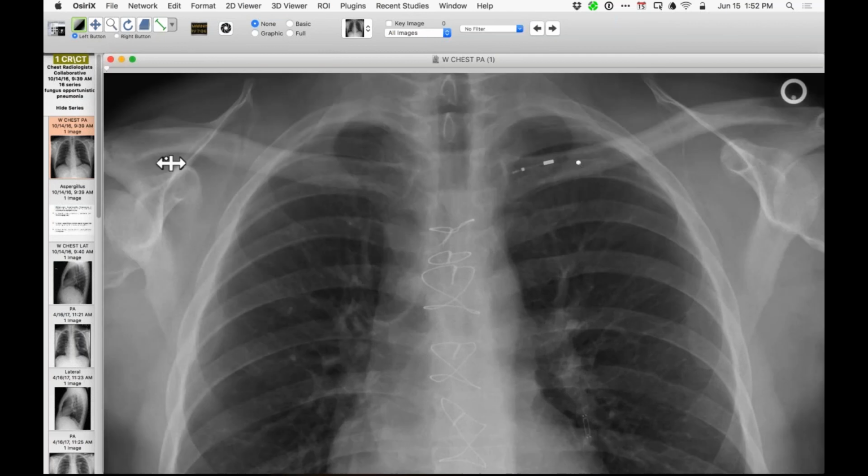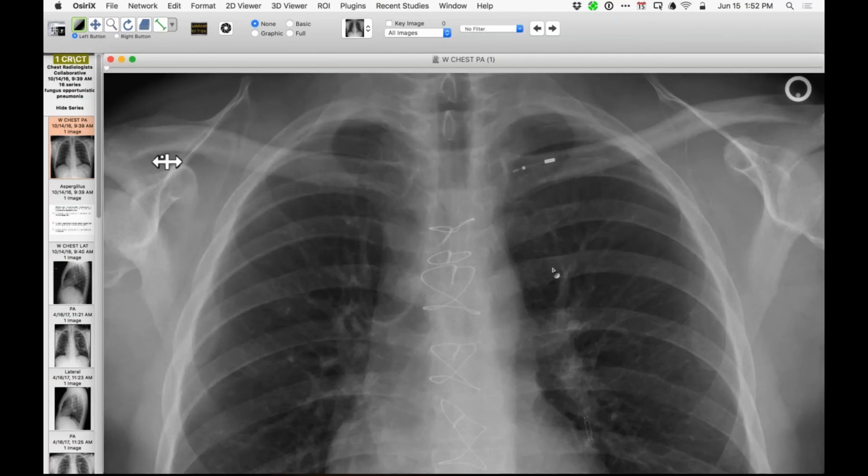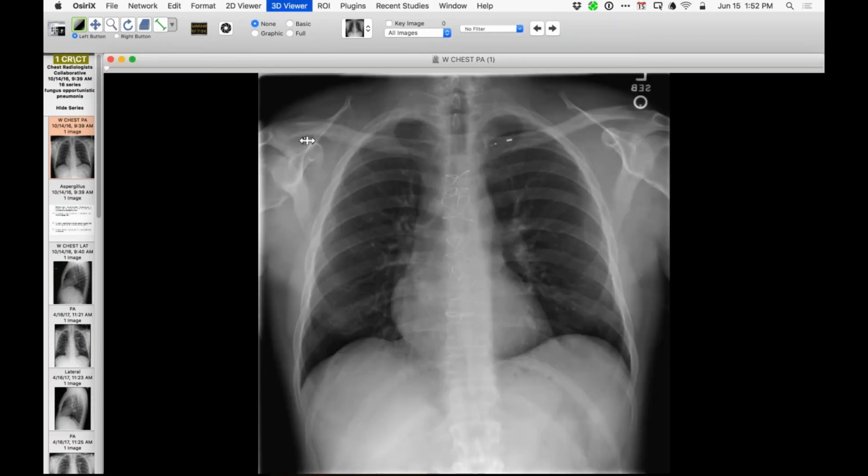I've seen quite a few cases. If you have remnants of pacemaker leads with the sternotomy wires, oh, this person has a CardioMEMS too. That's a clue that cardiac transplantation was the procedure that was done. And presumably sometimes these don't come out very nicely and they just shred them and then they leave these in.